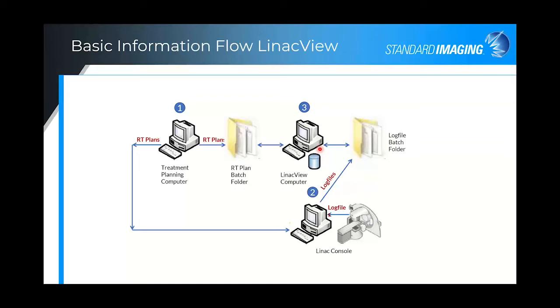And so just to show you how LinacView would be used in the clinic on a day-to-day basis, I wanted to show you briefly the view of LinacView that would be seen on the computer that is typically maintained near the Linac console.